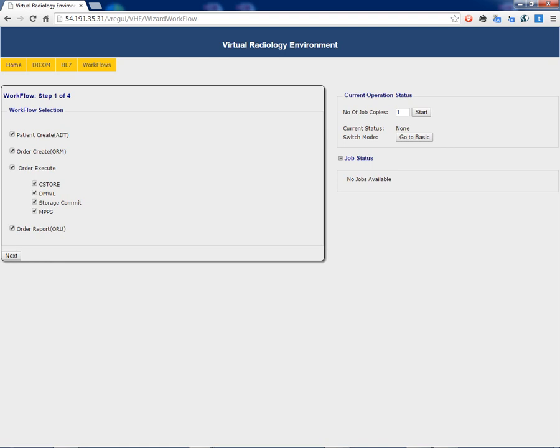As you can see, we will do the DICOM modality work list to query for the patient's header data, or portions of it. We will do a C-store, a storage commit, and the MPPS. And then in the end, we will have a report sent, automatically all driven with consistent patient identifiers and site identifiers across all the data parts that are used in the test. We can run this test for durations of time, controlling the intervals, controlling the number of modalities that hit the server, and many different flavors of how we do it. I'll run you through the wizard now.